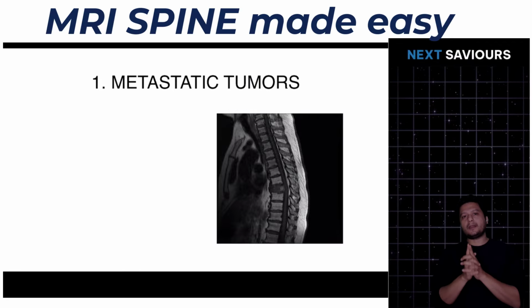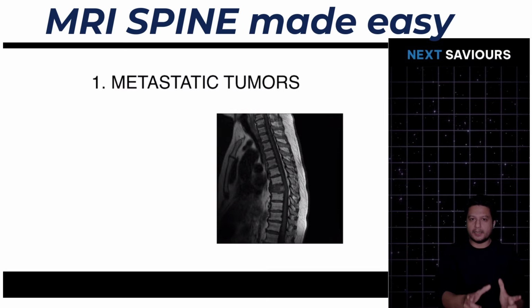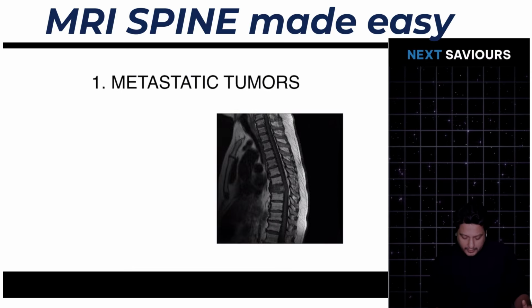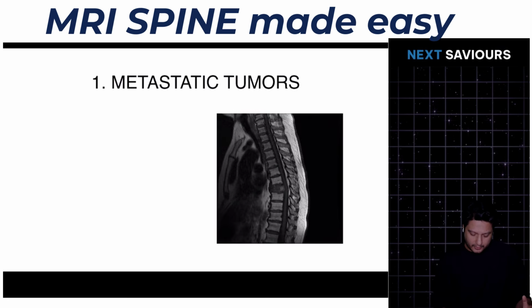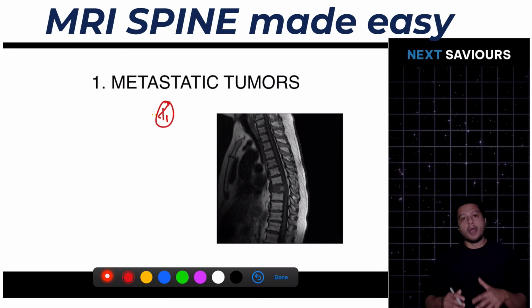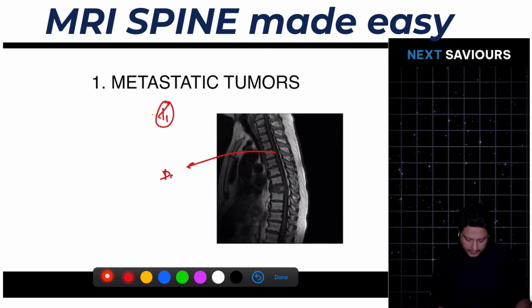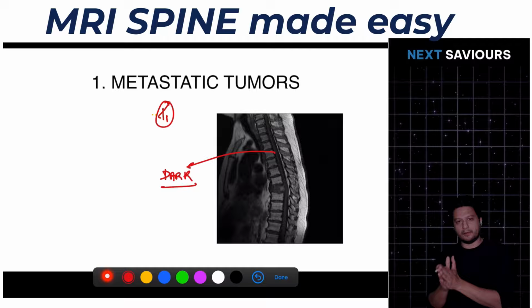But the point is, how will you identify that coupled with the long clinical question? Now, first of all, if you identify this MRI image over here, whether it is a T1 or T2 sequenced image. So the answer for that question obviously is that it is a T1 sequenced image. How have you identified this to be a T1 sequenced image? Because the CSF is appearing dark or black. So that is a T1 weighted image.